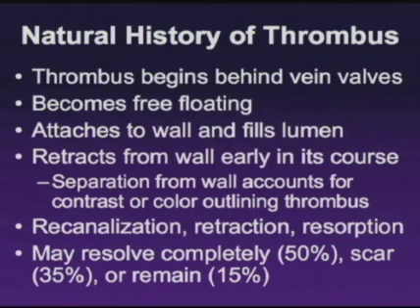As the thrombi again tends to age, it will separate from the wall, and this is why when we see most thrombi clinically, we can see flow around the edges of the vein, and also why we can see contrast flowing around the veins on venography. As the thrombi matures, it can start to pull back and retract against the wall. Holes or lines may appear within the veins, equaling recanalization.